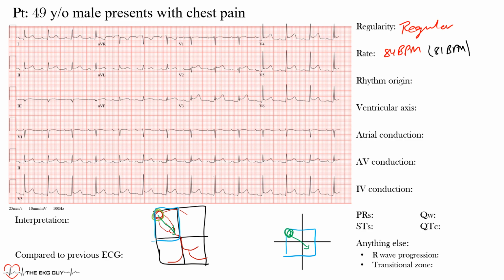If you imagine now that this is 0 degrees, like a quadrant system, this is positive 90, this is pretty much plus or minus 180 and negative 90 degrees. Notice that the normal P wave axis should be lying between 0 degrees and positive 75 degrees. So this is the normal P wave axis. Remember that there's a normal QRS axis, ST segment axis, T wave axis. In this case, we're looking at the P wave axis.